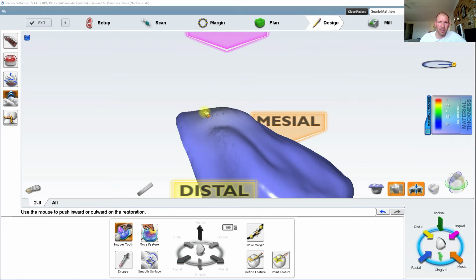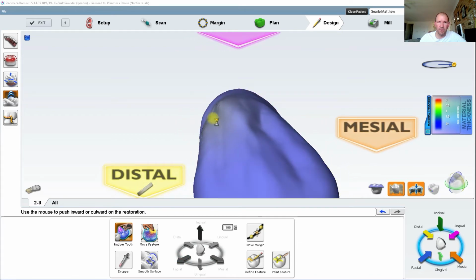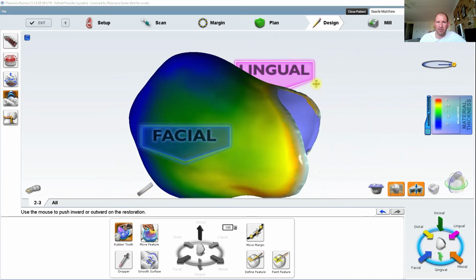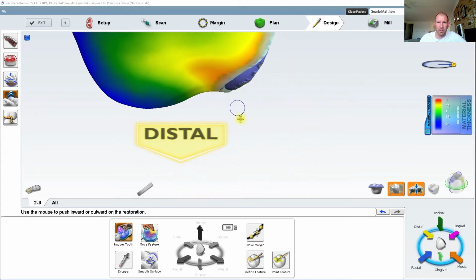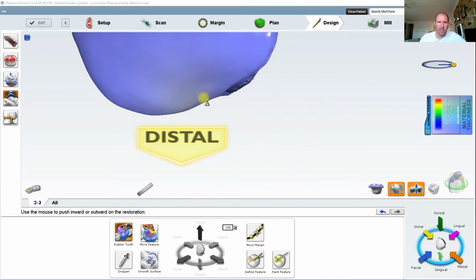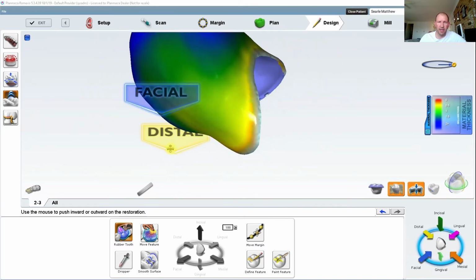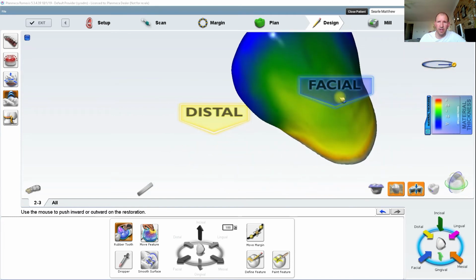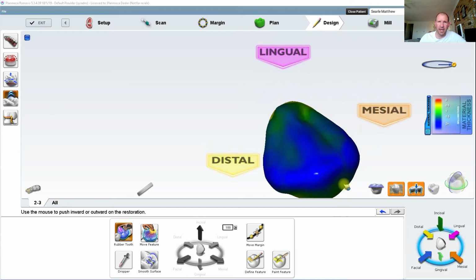Rubber tooth then obviously we'll adjust and move any areas out that we wanted to adjust. So once again, this is our slide scale, and it's going to allow us to adjust certain areas more than others. So I'm just going to bring some of these areas out a little bit so that we're getting a more full crown finish. You can see overall the thicknesses of that, I wouldn't want to go too much thinner, but that's going to be okay.